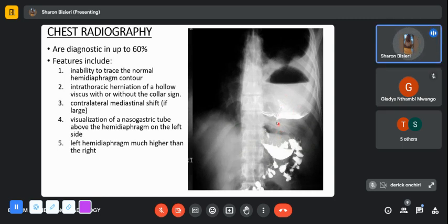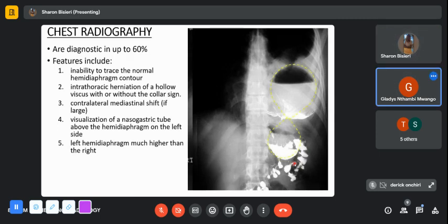Yes. Oh, yes, because I was wondering, this is the bowel that's coming immediately after the stomach, so I was expecting it to be duodenum or jejunum, but definitely it has features of being the colon, transverse and splenic. Yes, we are in the left upper quadrant. All right. Thank you.